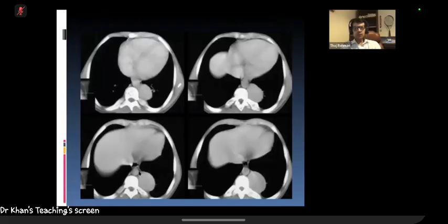So that's how it appears. Extramedullary hematopoiesis. Quite simple, isn't it? Neurogenic tumor or extramedullary hematopoiesis. You put the bone findings together, it's extramedullary hematopoiesis. You put rib scalloping, then that's a neurogenic tumor, neurofibroma.